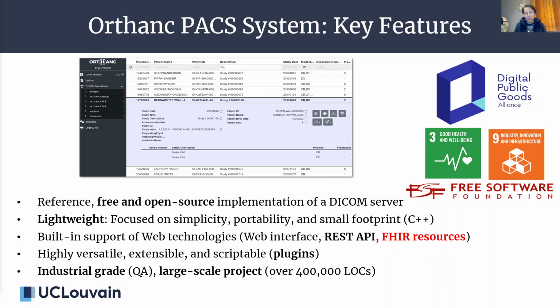This year, we developed the new FHIR imaging study. It reports the details of the entire DICOM study and associated information. The Orthanc Explorer tool should be used in future work. The image data can be uploaded via this Explorer to reduce the workload of GNUHealth.